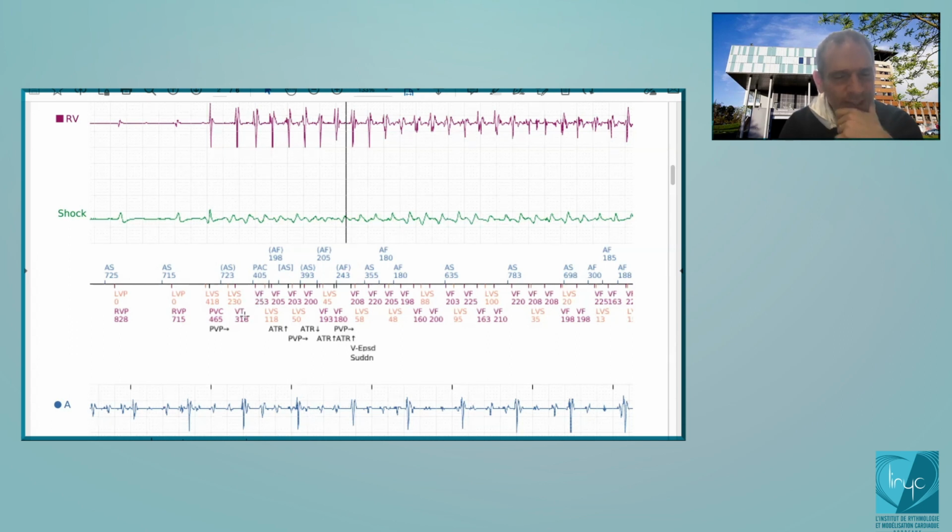So if you consider the VT counter, you have 1, 2, 3, 4, 5, 6, 7, 8. And in this signal, you have 8 out of 10 markers classified at least VT. So the V episode, the 8 out of 10, is verified for the VT zone. You understand that? Yes. So on this cycle, what happens?